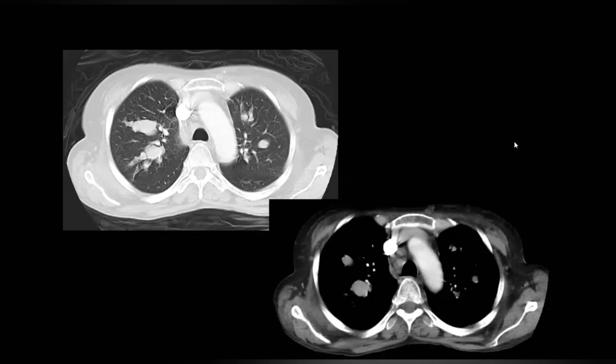It's basically the presence of the fungal hyphae. The fungal hyphae, yes. And this is not only in the thorax. Like if you have fungal sinusitis, you will see that there is hyperdense mucus within the sinuses. And yes, okay. So this is manganese. That is why it is hyperdense.